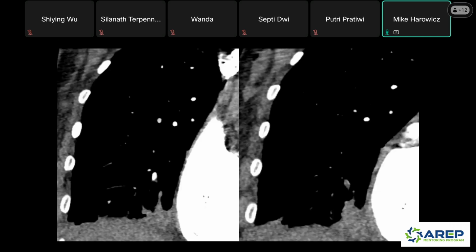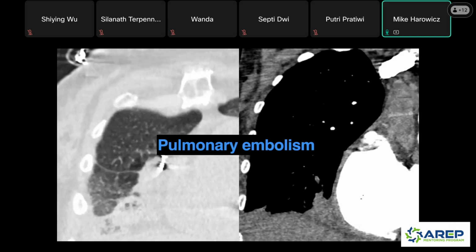So let me show you this. We had them get a PE study, and that obviously is very leading to what the diagnosis might be. But I did some two clips here of the pulmonary arteries. So focus your eyes right here on the left, and then that's, oops, same artery here. You can see there's a PE going right to that spot, right? Here are those opacities, and here's that pulmonary embolism. So this is a good look for a pulmonary infarct.